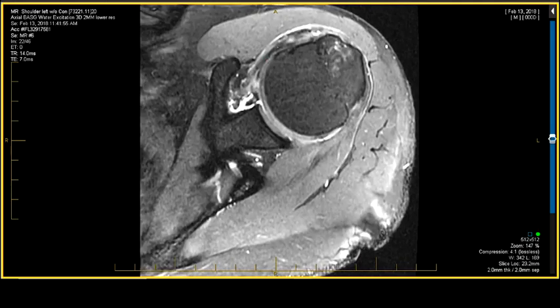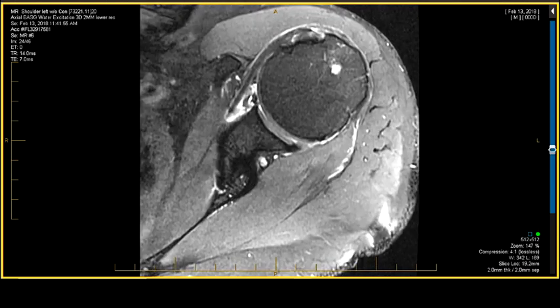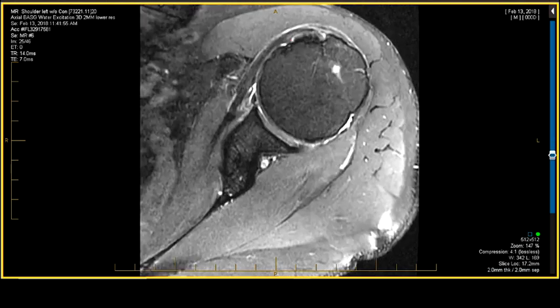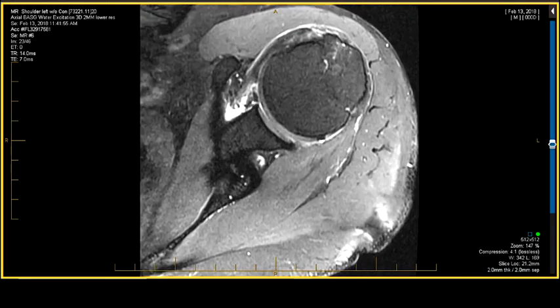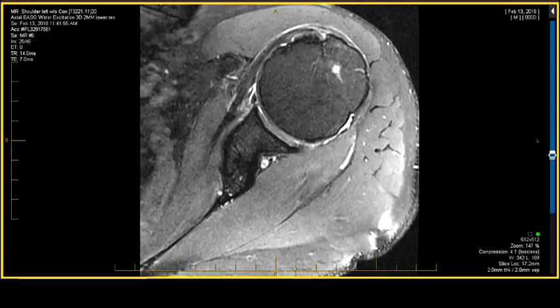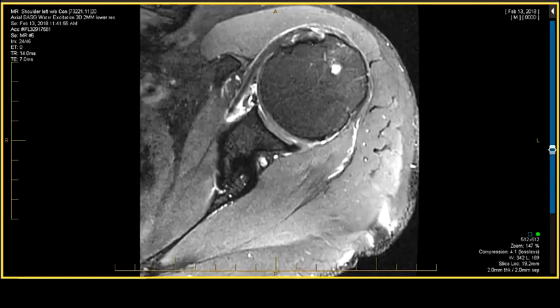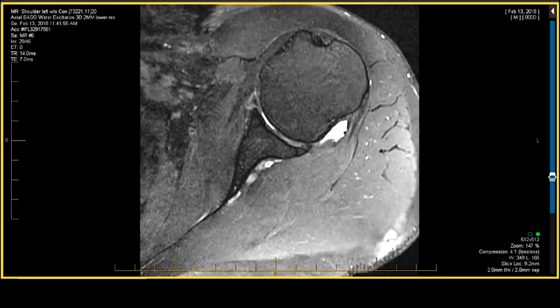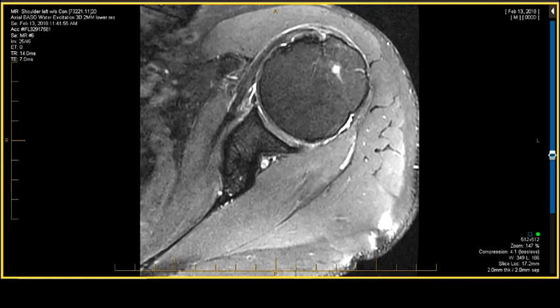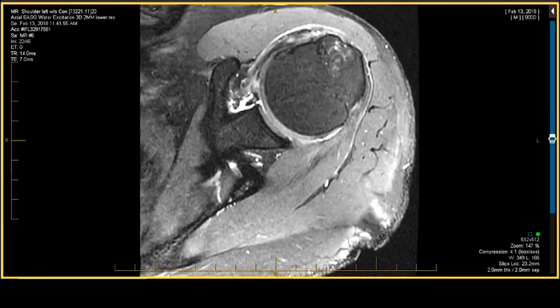I'll see if it has a nice, tight footprint to the lesser tuberosity, and the answer is, no, it doesn't. That's not nice and tight. In fact, it's a little white. So the deep fibers of the subscapularis are delaminating, and that's called a medial pulley injury. And when that happens, that will allow, in some cases, the biceps to prematurely and medially exit, which this one is doing right now. And it's swollen too, you can hardly see it.